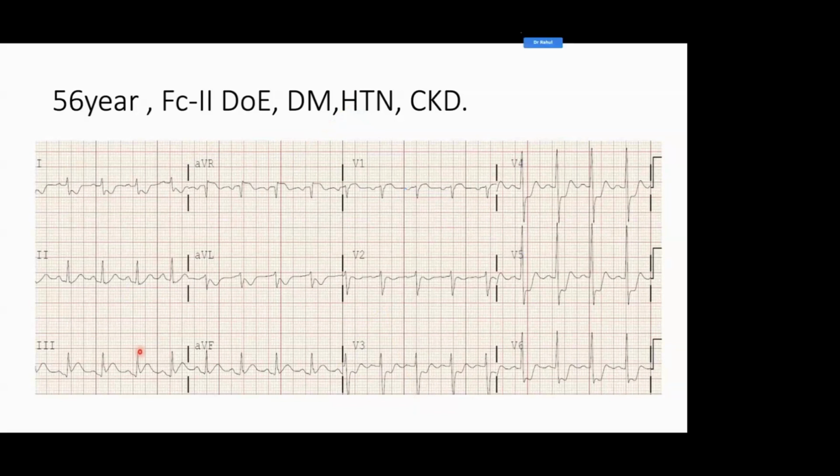The patient will be very sick because his heart is fully ischemic. He can go into VT, he can have cardiogenic shock. He can suddenly die. Pulmonary edema will set in. All those problems. So this is a very sick patient. This ECG tells you the patient is very sick.